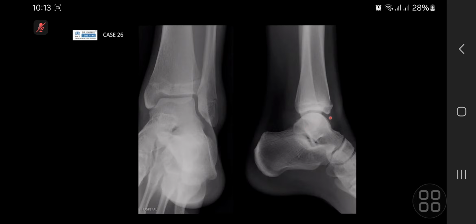And then when you're looking at that, you're thinking of any intra-articular processes going on. It's trauma, so I won't be thinking of JIA. But if you look again closely, you're drawing contours. If you come down the metaphysis and suddenly you've got a little step here, okay? And then you wonder, yes, I know the physis can be irregular in the distal tibia, but I just wonder if there was something a little bit odd in the front bit here. And then if I take a look again, thinking, okay, is this a fracture? There is a lucency that's just behind this at the tibial epiphysis.